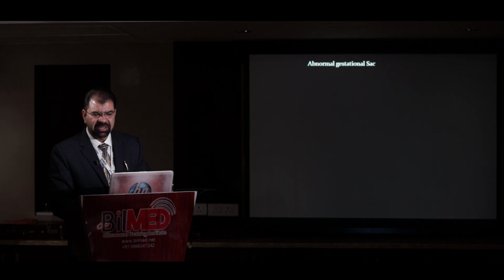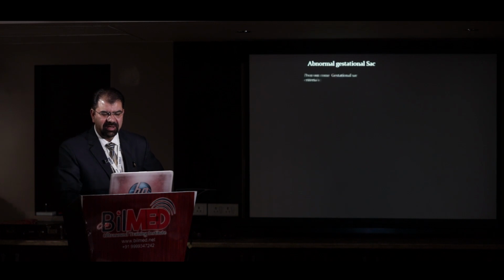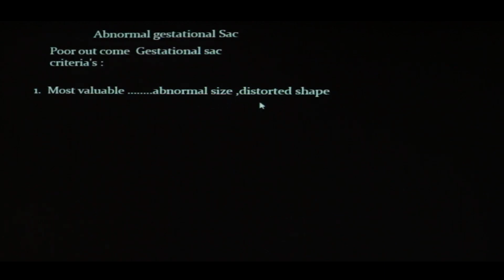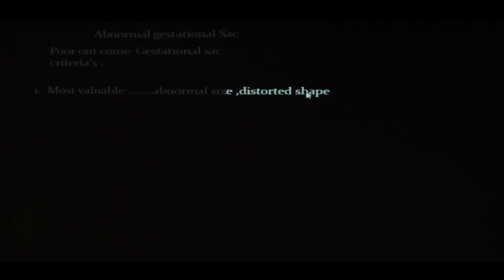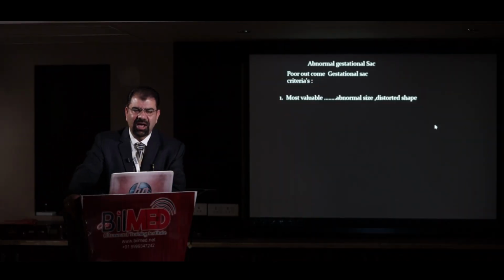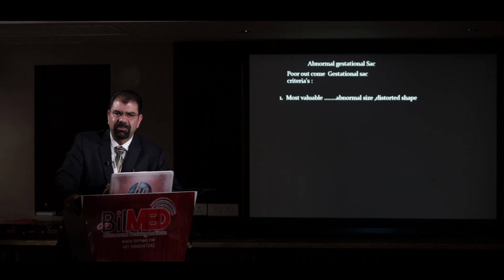So now let's take some 2-3 slides of abnormal gestational sac. Now, what is an abnormal gestational sac? Most valuable is if it is abnormal in size, or distorted in shape.